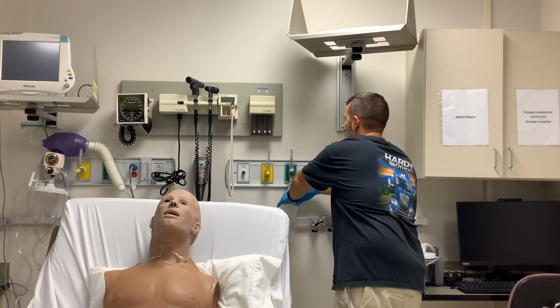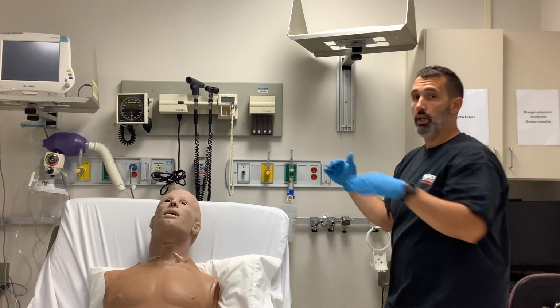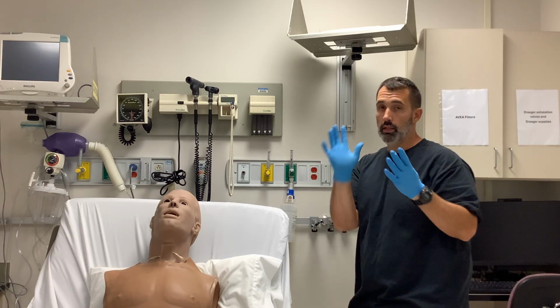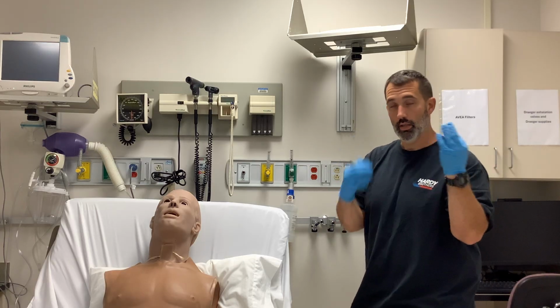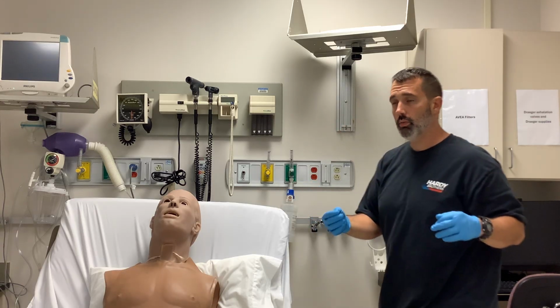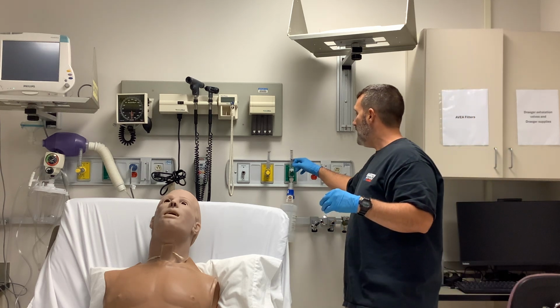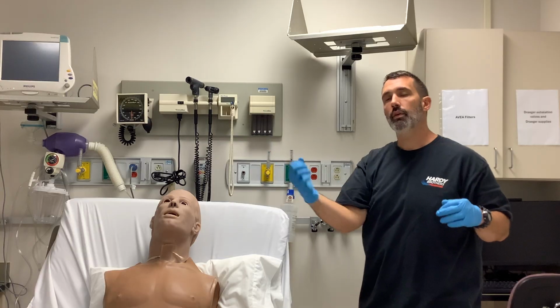So if I switch this collar to 60%, you heard a little bit of a change in intensity, because at 40%, at a liter flow of 5, our total flow through the system was 20, because it's a 3 to 1 ratio. I've switched this to 60%. So we'll notice that window closed up a little bit, because it's going to entrain a little bit less air with it. So at 5 liters per minute, this is only going to pull in 5 liters of air.